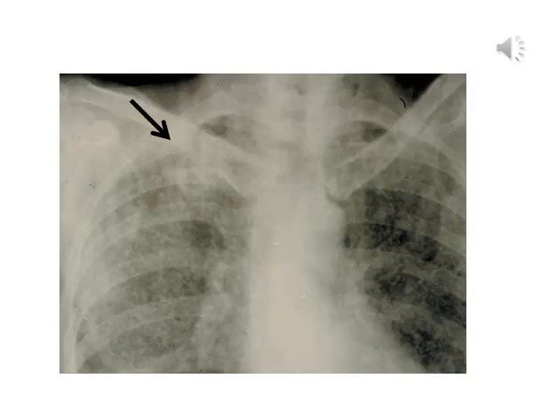This is miliary tuberculosis in an adult woman. She was also sputum smear positive for acid-fast bacilli, a usually rare finding in this type of tuberculosis. The reason for the sputum smear positivity is because of the cavitary lesion in the right upper lobe, marked by the black arrow here, which is draining directly into a bronchus, as can be clearly visualized by the air bronchogram.